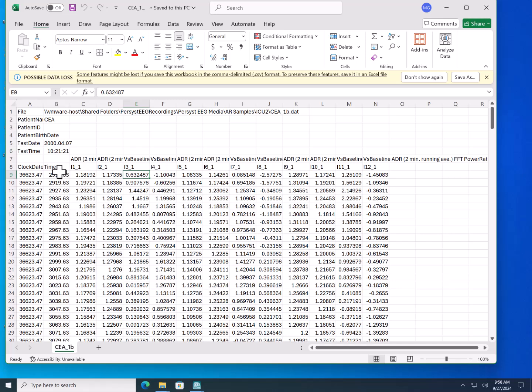And here's the time. So this is the elapsed time, the number of seconds into the recording where I placed that, and you can see here that it's incrementing based on the epoch length. And then this is Microsoft OLE time, which encodes both the date and the proportion of time after midnight as a fraction.